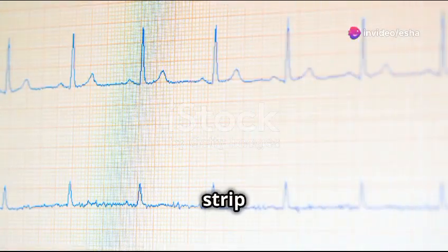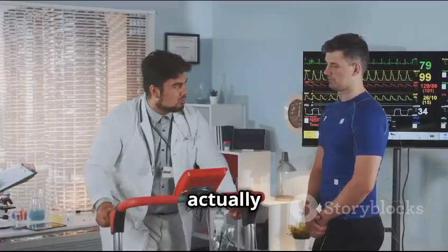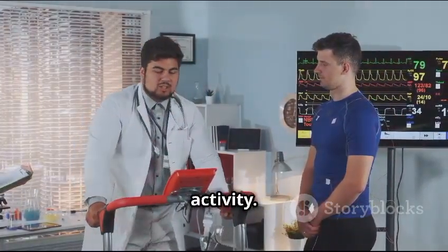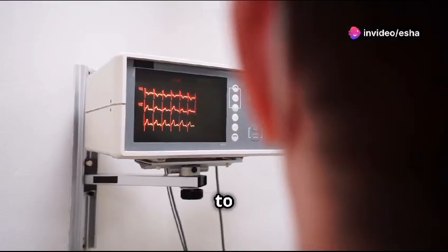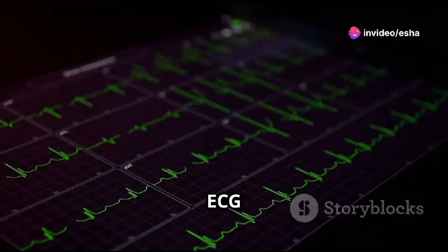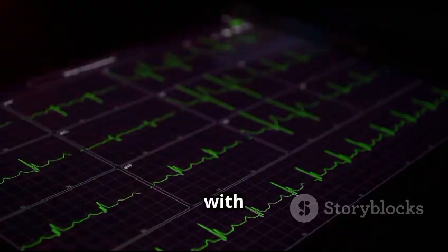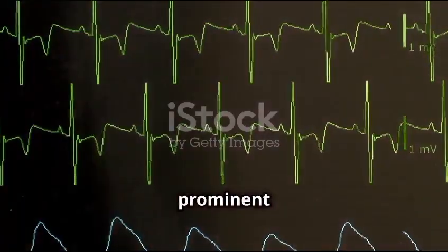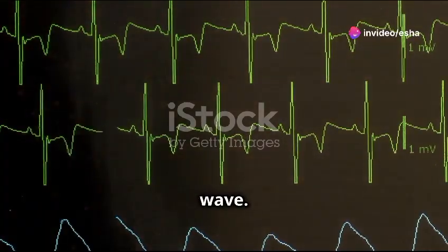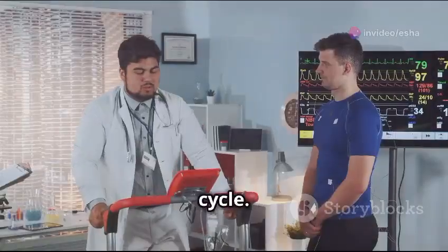An ECG strip might seem like a jumble of waves and lines at first glance, but it's actually a highly organized representation of the heart's electrical activity. To decipher the code, we need to understand the basic components of an ECG waveform. The ECG tracing consists of a series of waves and segments that repeat with each heartbeat. The most prominent features are the P wave, the QRS complex, and the T wave. Each component represents a specific electrical event in the heart's cycle.